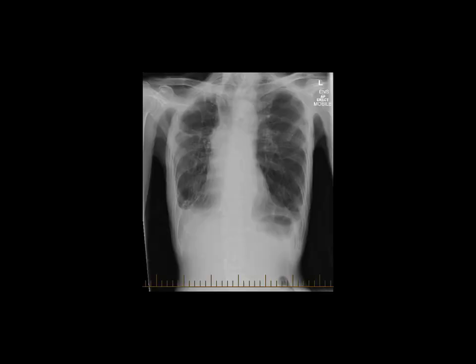That was his chest X-ray from earlier on. So there were chronic changes, definitely. And to be honest, I think his COVID was just a mild disease, but it was enough for him. He was on a knife's edge anyway with all his comorbidities, and that was enough to tip him over. And I think his COVID wasn't particularly severe. So you see there's this chronic pleural effusion.